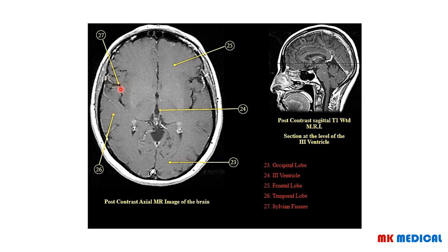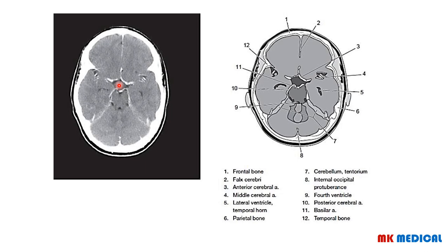So here's another much more detailed thing. As you can see here now is a CT. This is a CT image. So you have the different parts that are labeled there. So just take your time to actually trace whatever you can see on this image, this diagram, to whatever you can actually see on the CT scan. Pause the video at this moment, and I've already talked about them in the prior sections.